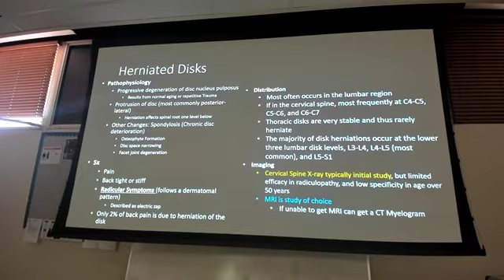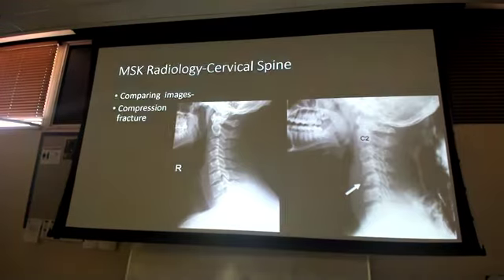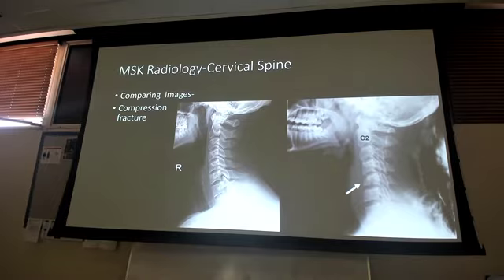Questions on the compression fractures? Ironically, one other thing, what do you think compression fractures could potentially lead to? Something we already briefly talked about. The spondylolisthesis, right?